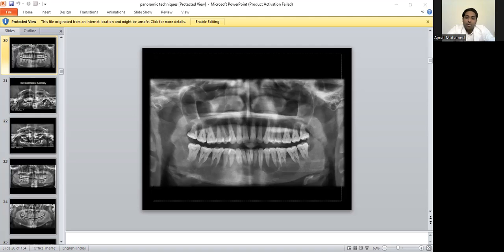You can find small internal septa in and around this large lesion that is happening from the left mandible, the posterior region of the ramus, extending into the anterior portion, crossing the midline, going to the right side. All the mandibular portion is affected with this.